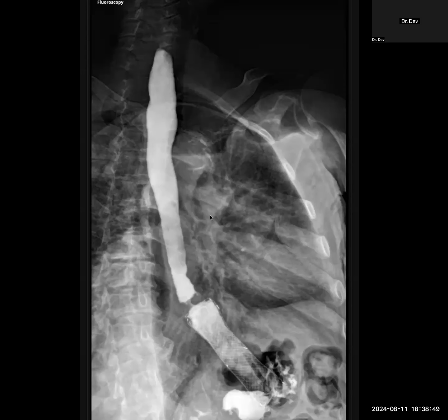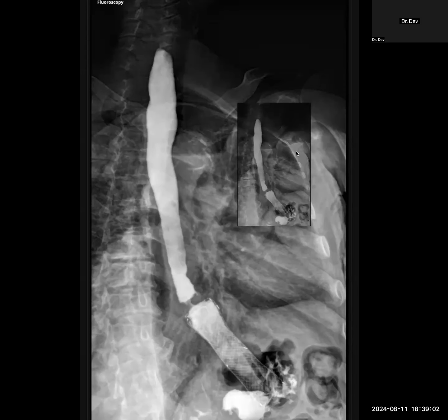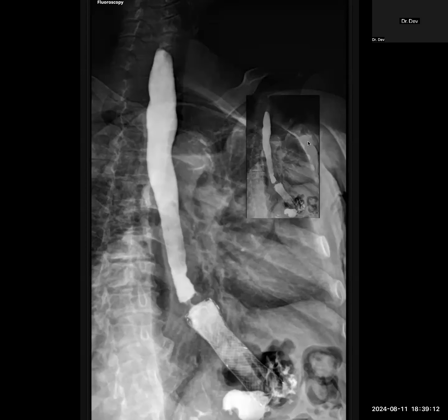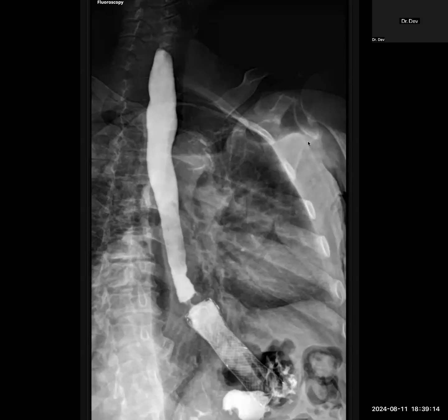This is a case of esophageal stent migration, which you got to eventually, but you needed help. But you did explore the possibility that it could be a recurrence above the stent. It's not impossible; it can happen. Other than that, you described this one well. There's not much going on here, except that I wanted to keep a case of stent migration. We don't see this very commonly, but it is something that can turn up in the exam.